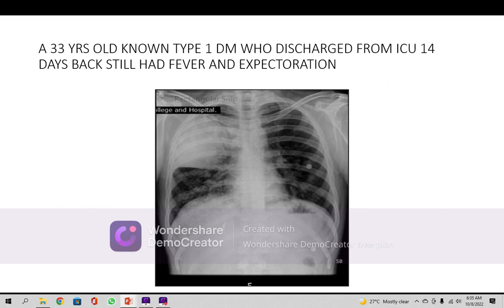The chronic inflammation of the lung with tuberculosis can present as a pneumonia in our zones, in eastern countries, and they may be present like acute inflammation, so the second differential is the tuberculosis.